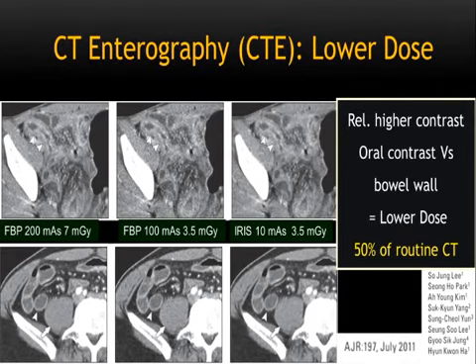They apply iterative reconstruction. Yes, it does denoise the image. No, it does not add any additional information whatsoever. What does it tell me? Well, this paper perhaps kind of over-radiated this patient for what they were using. They could have gone even lower, and then the advantage of iterative reconstruction would have kicked in.